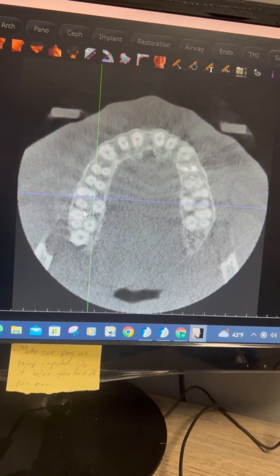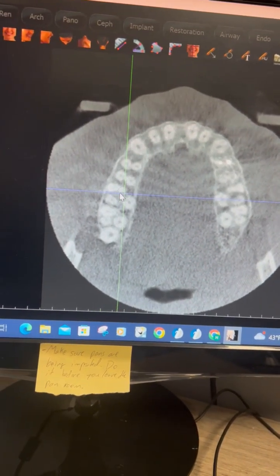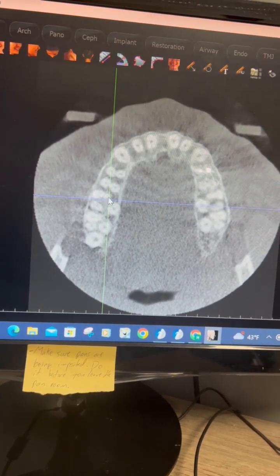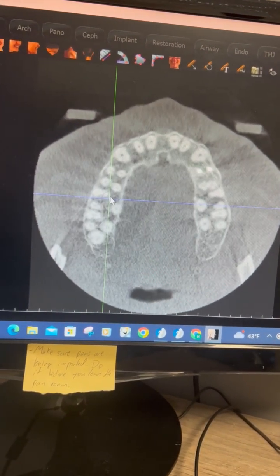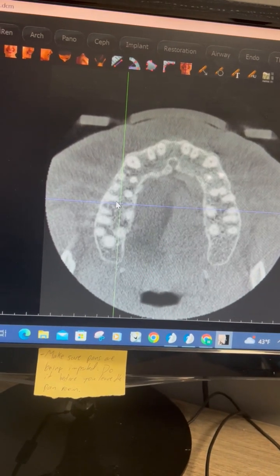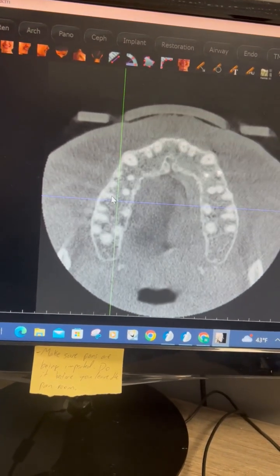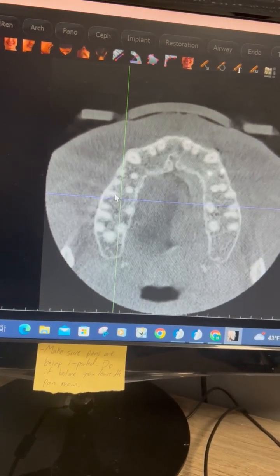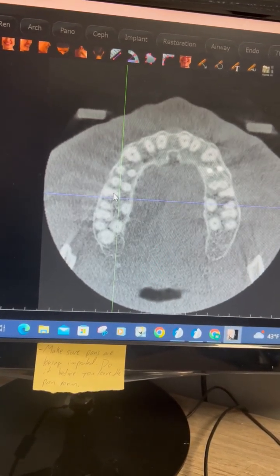On this one, you can see a distal buccal, a palatal, a mesial buccal 1 and a mesial buccal 2. So there's an MB2 canal on this. That's why it's really important to use your CBCT. You can see how the MB2 canal actually stops about halfway into the MB1, so it's only going half the distance. When we notice that, we can measure this.